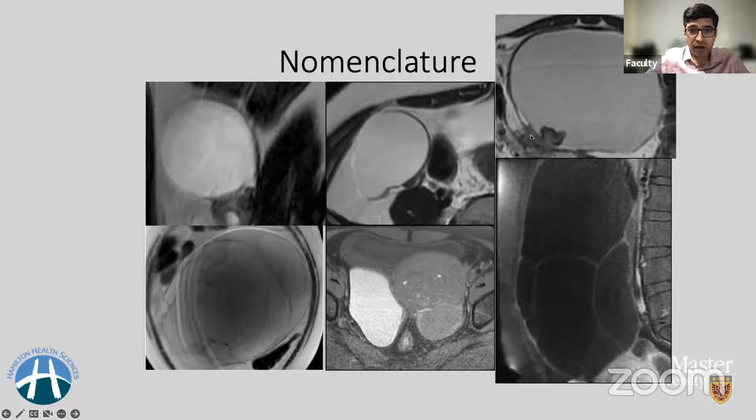If you see any solid tissue in cystic masses, but it shows a low risk dynamic contrast enhancement curve, it is going to be O-RADS 3. So for these lesions to fall under category 3, you need a dynamic assessment. If you don't have dynamic assessment, you may not be able to classify it as O-RADS 3.